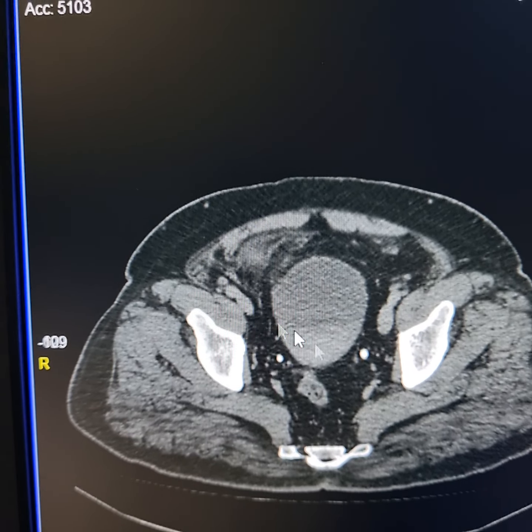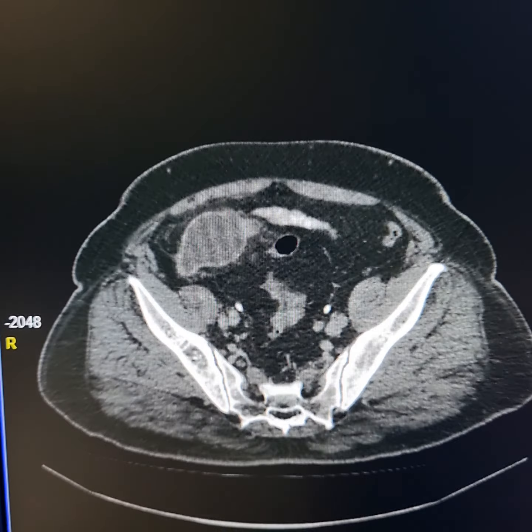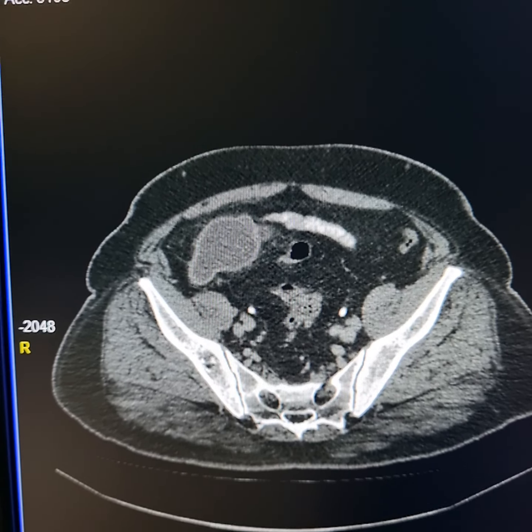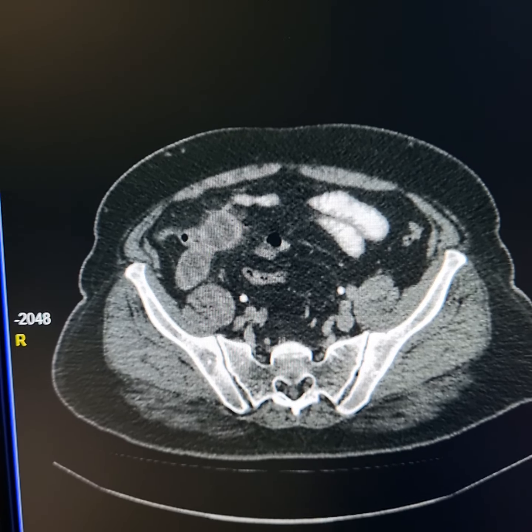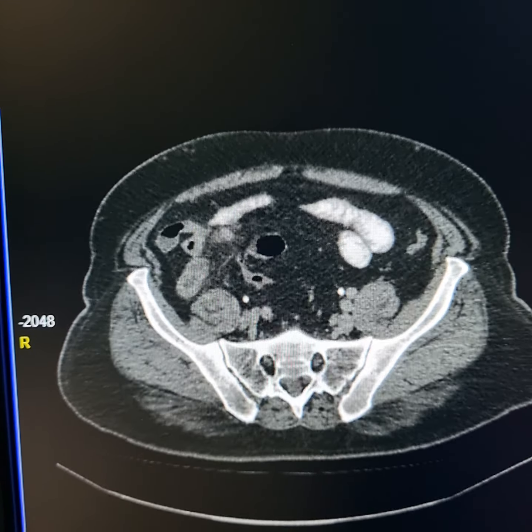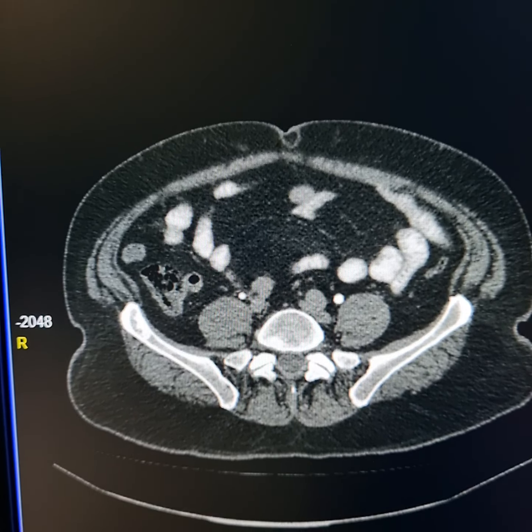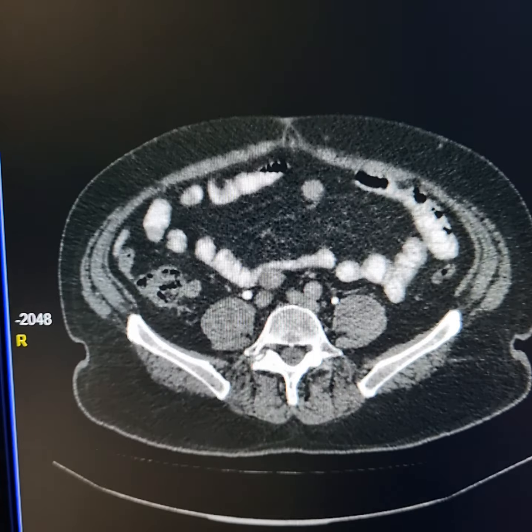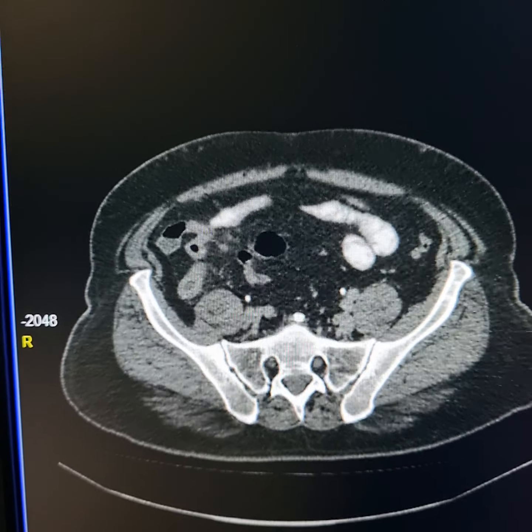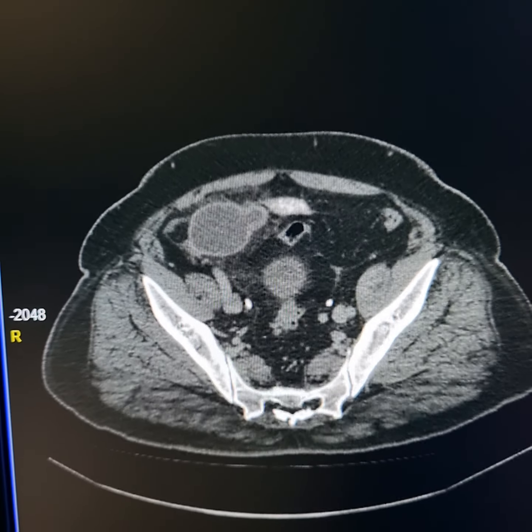Please observe this thickening here. It is not an appendicular abscess. In appendicular abscesses, we are all familiar with the appearances. They are thick-walled. Surrounding soft tissue density shadows are present. The increase in the density of the adjacent fat is much more, and the patient presents with symptoms of acute pain in the right lower abdomen.